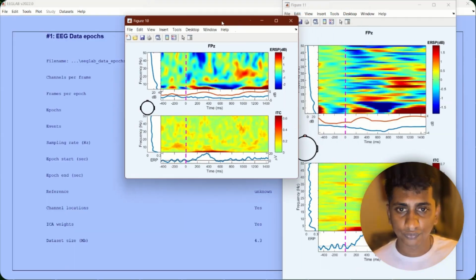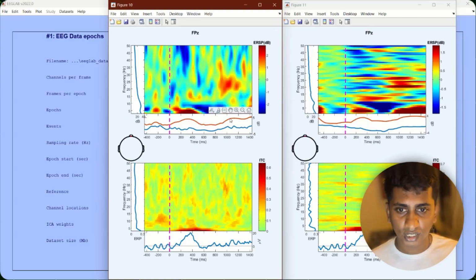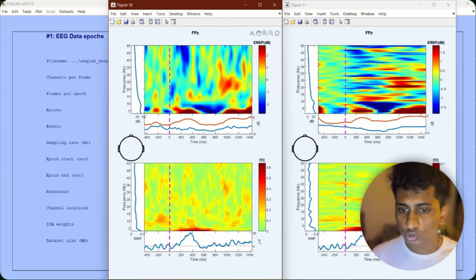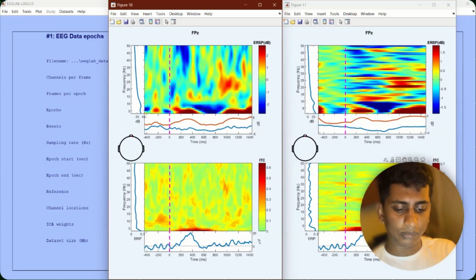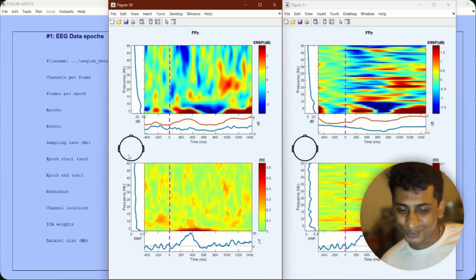Showing you what it is. Okay. So this is without FFT, and I'll show you with FFT also. We'll change the settings, this FFT ITC place here. Yes, there is a noticeable difference, like you can see with and without FFT. Fast Fourier transform basically. So this is an image processing technique which we can use. You can see the difference in the graph also, how smoothened it is. This is one of the applications of FFT, which you can Google and see, rather than me explaining it, because there are a lot of other things to go.